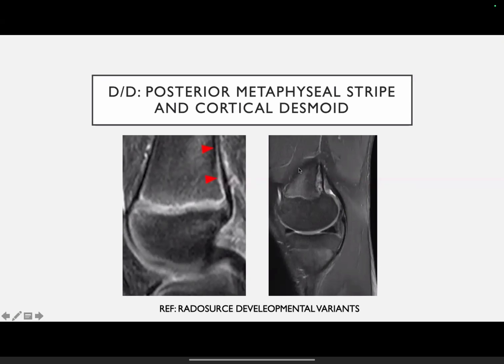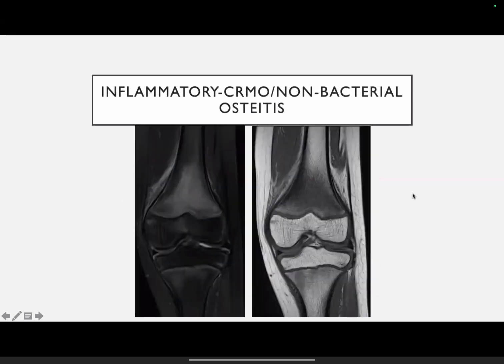We should know the pitfalls also, and we should know what is normal and what is abnormal. So with periphyseal pathologies, a lot come from the focal zones and from traumatic events, ranging from periosteal stripping, Salter-Harris injuries, and impactional injuries, and we should know the normal anatomical or developmental variants.